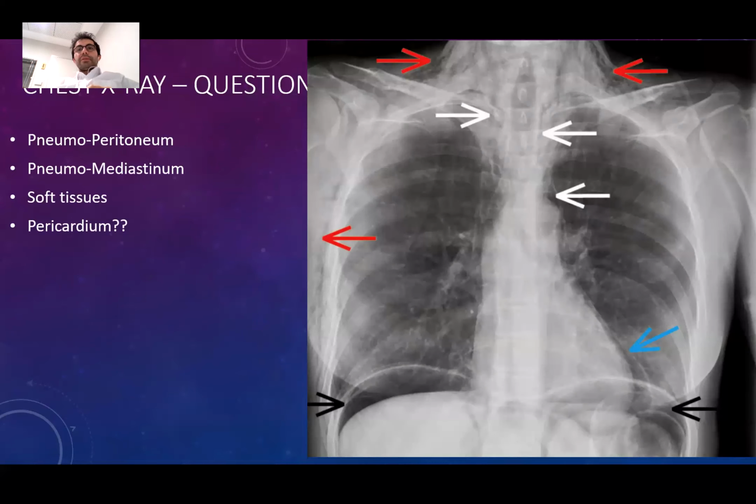Let's go to the next patient. The diagnosis is pretty obvious. I didn't show you any case of this, so it will be mixed pathologies altogether. We are seeing subcutaneous air in this patient.